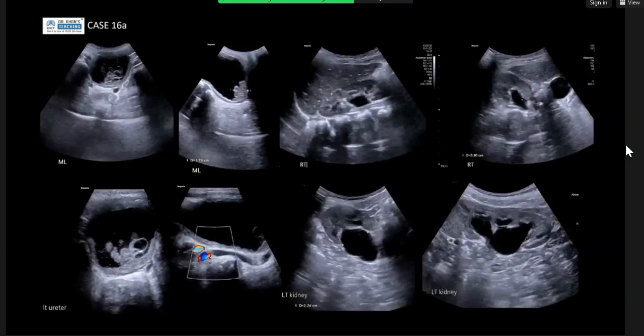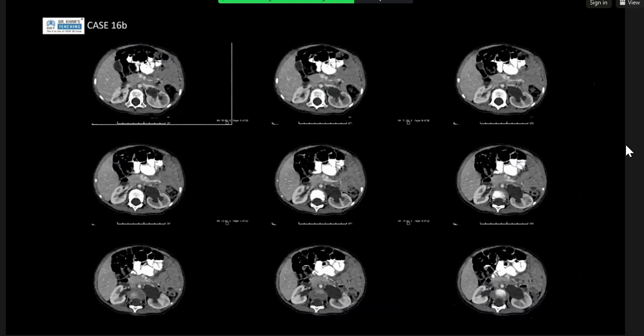So the epicenter of the lesion is within the urinary bladder polypoidal mass, which is causing bilateral renal obstruction, causing upstream hydroureteronephrosis. Are there any other images? There are other images, but you can have a look. These are the contrast CT images showing evidence of dilated pelvicalyceal system and ureter on the left side and also on the right side.